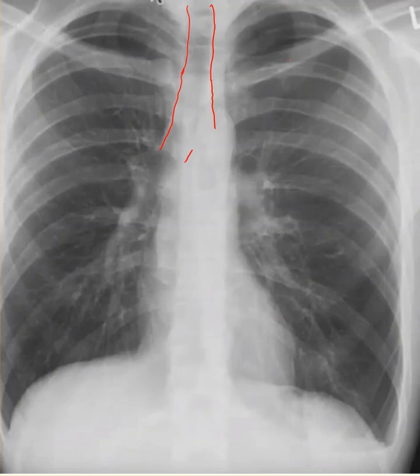And it looks like the carina is right about there. So you can see this airway may be starting to shift to the patient's right a bit. Maybe not. Looks like it might be shifted a little bit, so that's a little concerning.